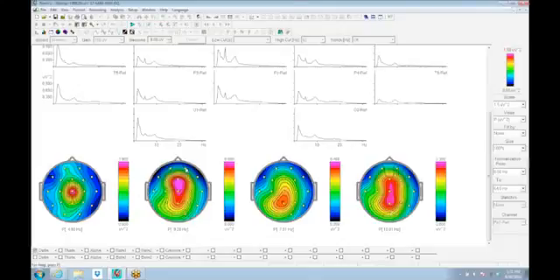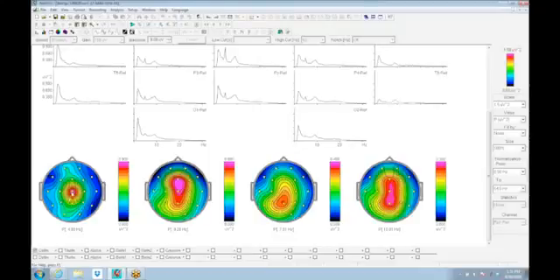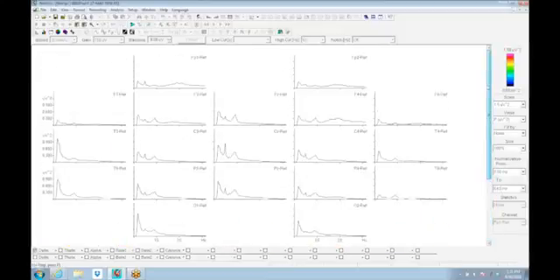The lines of contour are kind of like a weather map. Some people like them, some people hate them. I think they're somewhat useful in trying to show something as being localized or focal in some circumstances, but they can also overdo the focus. If you've got something that's generalized but it's maximum in a spot, you can end up with a map that overdoes a focus. So you've got to make sure that you go back to the raw data, not just your maps.